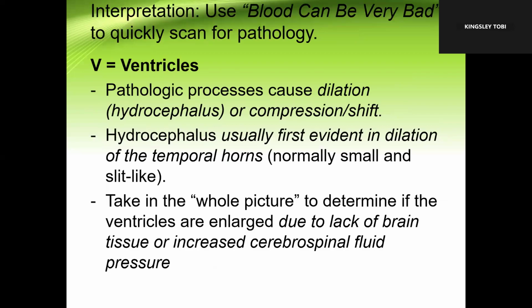Then look at the ventricles. All right, is there any dilatation? We had a case scenario earlier on of non-communicating or obstructive hydrocephalus, okay? Especially the temporal horns of the lateral ventricles are usually the first to be dilated.